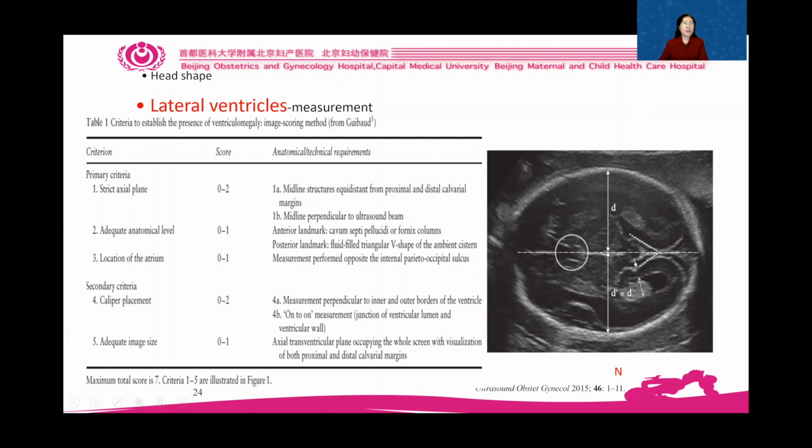But most severe cerebral lesions are bilateral or associated with a significant deviation or distortion of the midline echo. In a screening examination, symmetry of the brain can be assumed.